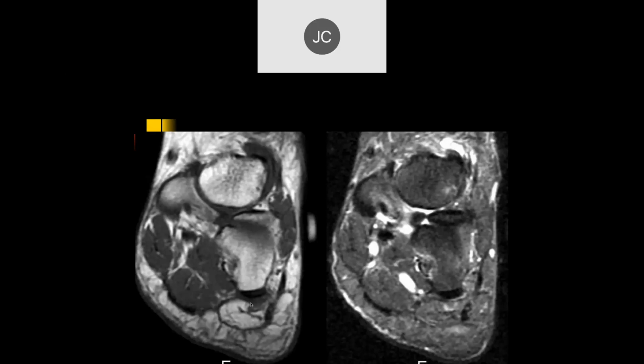So there is kind of a discussion as to what produces isolated fatty atrophy of the abductor digiti minimi. It may well be that it's trauma to Baxter's nerve, and that the vast majority of people with Baxter's neuropathy actually don't develop clinical symptoms and therefore are silent.